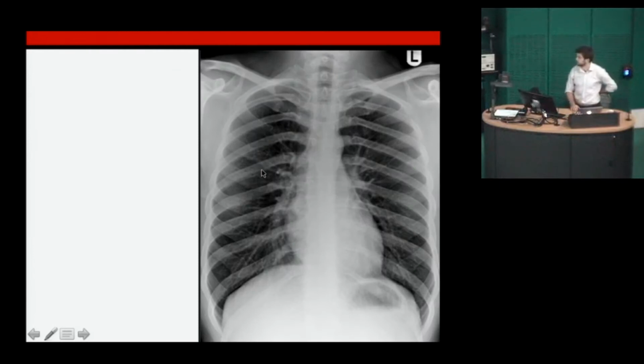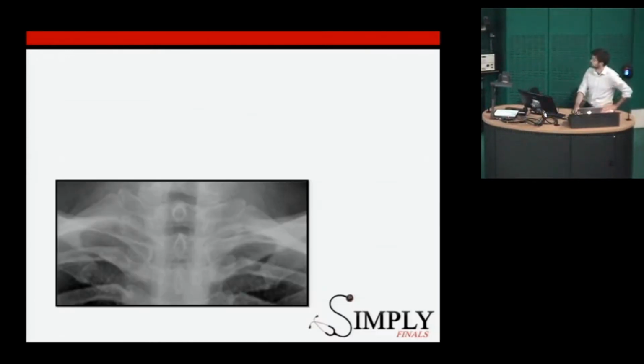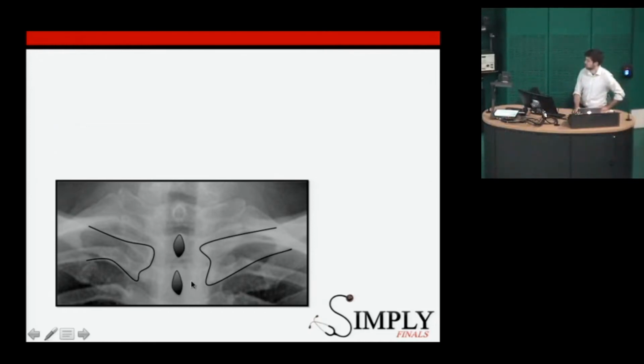So how do you assess for rotation? Clavicles and the spinous processes. So we're all happy with that? Yeah, so this image, is it central or rotated? Central. Yeah. So just zooming in on that, for those of you who weren't sure, the clavicles you can see, and then these spinous processes, and they're pretty much in the middle of this image. So then you can move on.